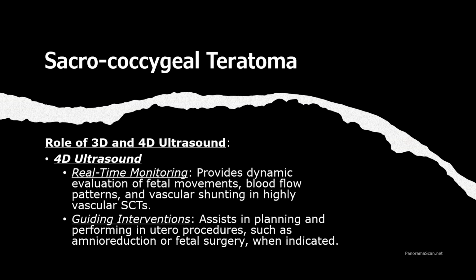Guiding interventions is another key advantage. 4D ultrasound plays a crucial role in planning and performing in utero procedures such as amnioreduction or even fetal surgery when necessary, ensuring the safety and well-being of both the fetus and the mother.